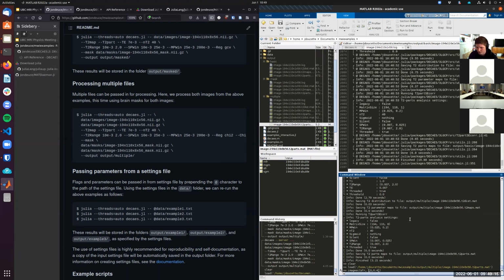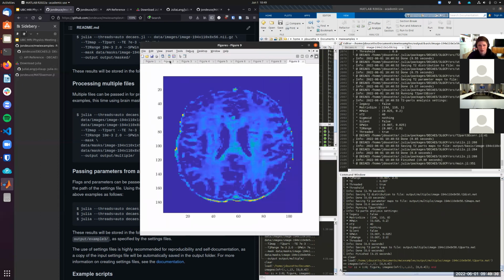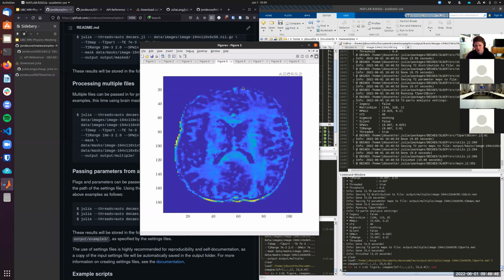And so if I load, say, the T2 parts for this 8 slice image, I can now plot the myelin water fraction, let's say, of the first slice of this image. So that's that one. So I can plot the second slice, or plot all the slices one at a time. So now we got, there we go. So this is the first, second, third, fourth, fifth, sixth, seventh, and eighth slices. So this is just stored as a 3D matrix in the same size as the input.